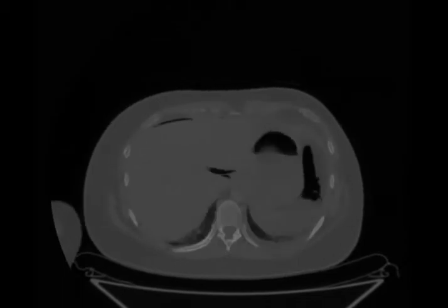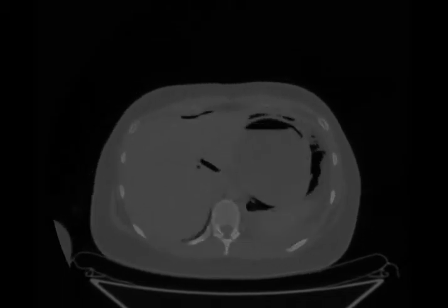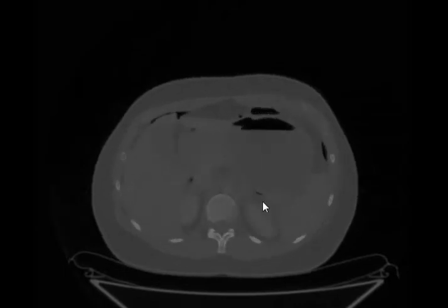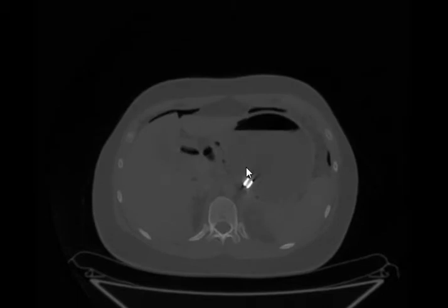It is due to perforation of the stomach, which is very unexpected in endoscopic balloon insertion. The case was opened, there was a perforation, and it was sutured and the balloon removed. She didn't drink oral contrast, so it's very difficult to detect the place. Without oral contrast, you don't know where the site of the leak is.